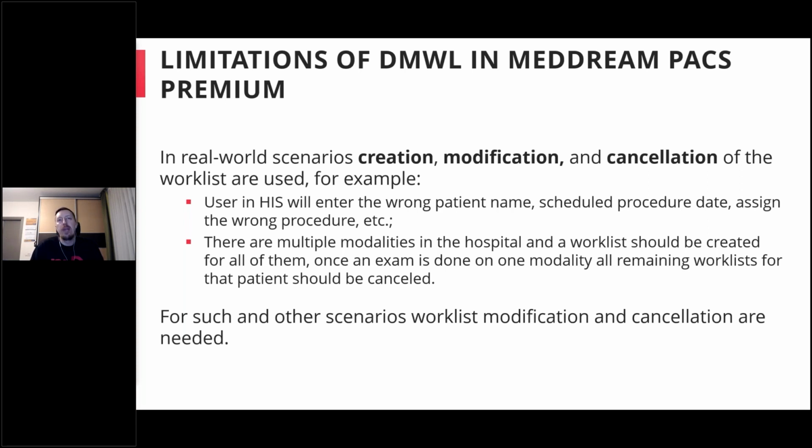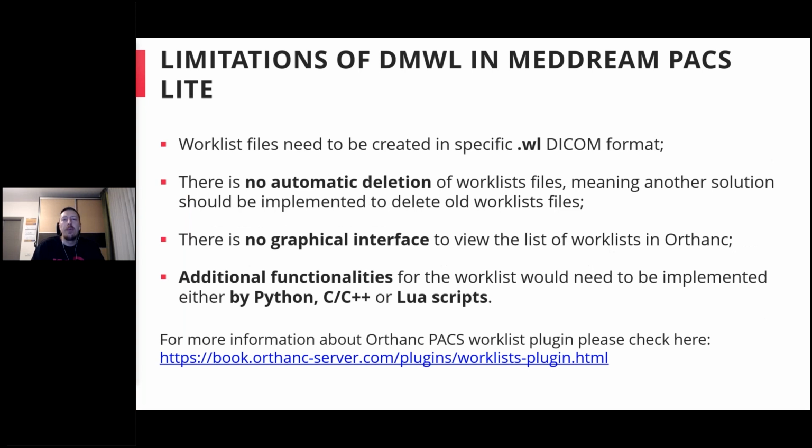The worklist would already be created. So once they edit this in the HIS system, they would need to send the modification or cancellation message. So for such scenarios and for other scenarios, the modification and cancellation of these worklists usually are needed.